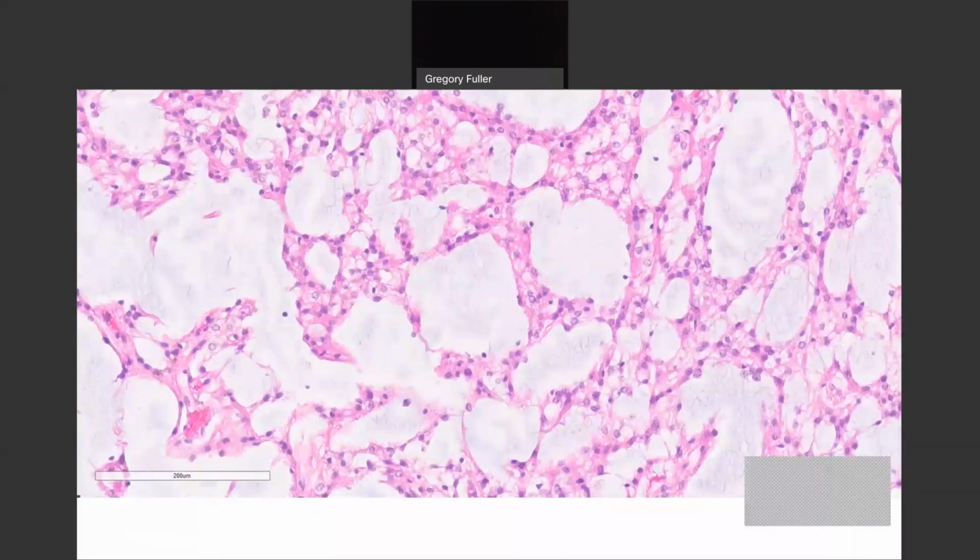All right, here's the histology. Take a look. I want you to be thinking. Let me give you a hint. That post-op was just a freak thing that I wanted to show you with the air bubbles. Eliminate that from your mind, okay? Just think about the histology. What do you think the diagnosis is? And then I want you to predict what the real imaging, the pre-op imaging, looked like. All right, you seeing this?